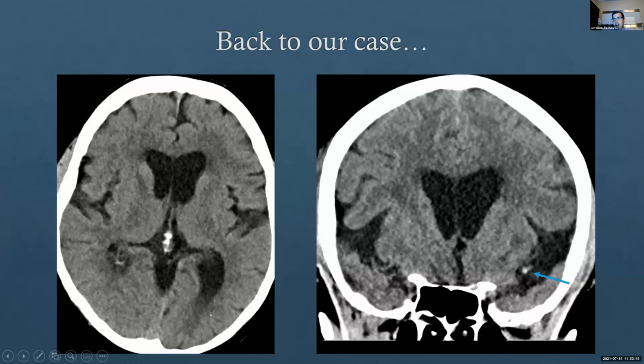So she doesn't have signs that she already has dead brain tissue. But if you can see, a little subtle there, this is the vessel, her middle cerebral artery, and it's bright. So she has what's sometimes referred to as the dense MCA, dense meaning bright, which indicates that we think she has a clot, a thrombus, there.